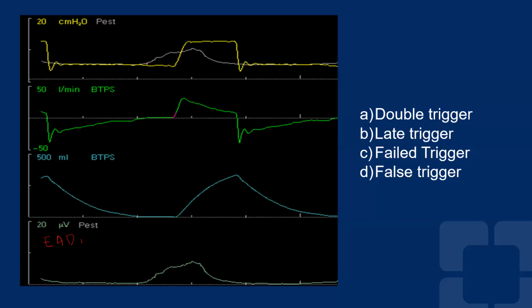Yes, thank you Yusuf for asking that. So usually here I put a nice example. I put all the types of trigger issues. And in the second one right here, you see what you would normally see. You would see the drop in the inspiratory pressure, that it takes a fair amount of time. And this is where there are still ambiguities. I don't possess all the answers, nor do I ever aspire to have them, on what's the length of time for a late trigger.